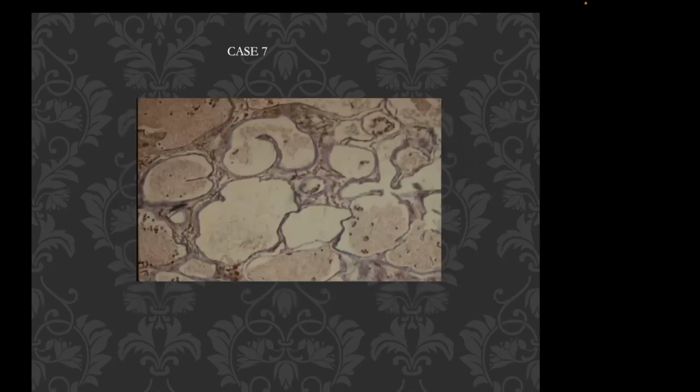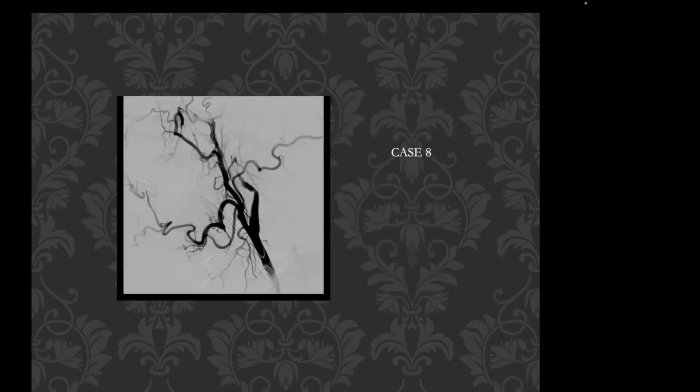This one is kind of odd, maybe not in the stroke realm, but I just want you to emphasize that when you see dilated vasculature with no intervening brain, this is typical for a cavernoma. And again, that is why cavernomas lend themselves to resection, because there is no brain inside of the hemosiderin ring, allowing you to resect the cavernoma itself.